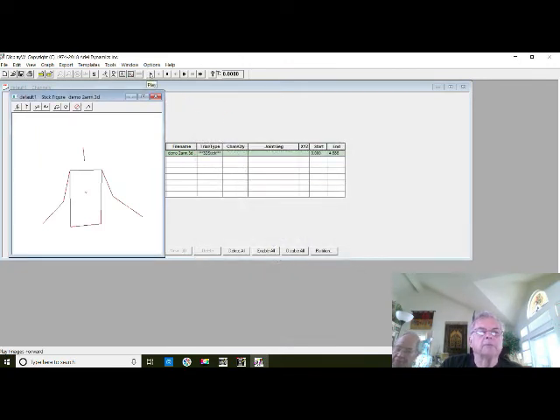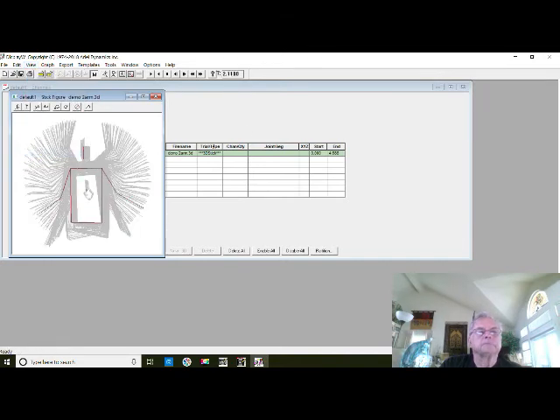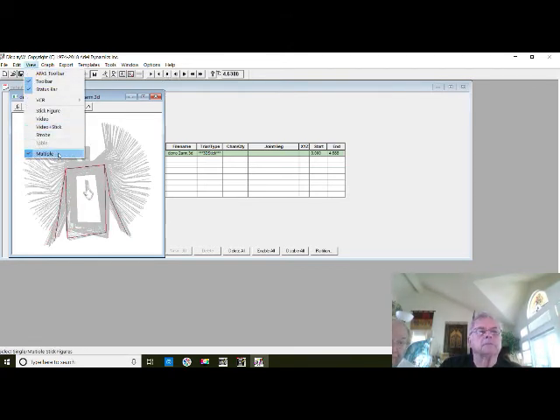We'll try it. We'll say play. Looks pretty good. We'll look at it in multiple views. And we'll stop it. Take away the multiple views.